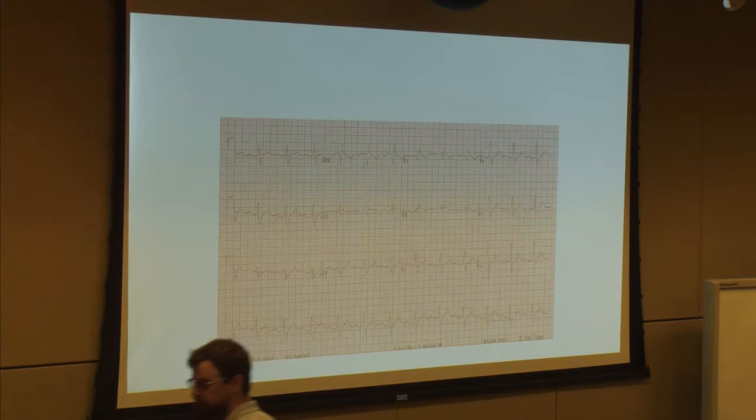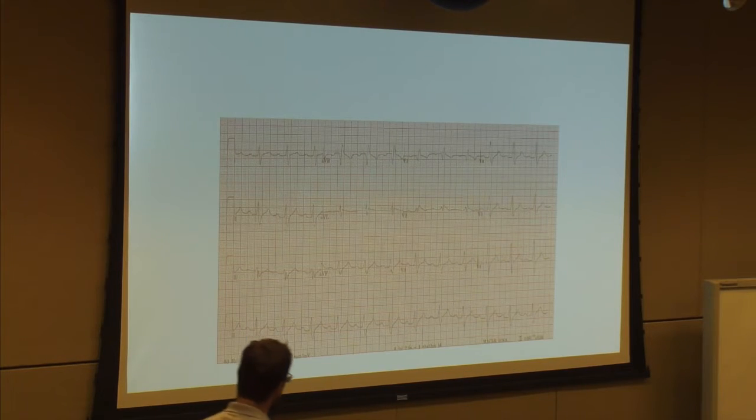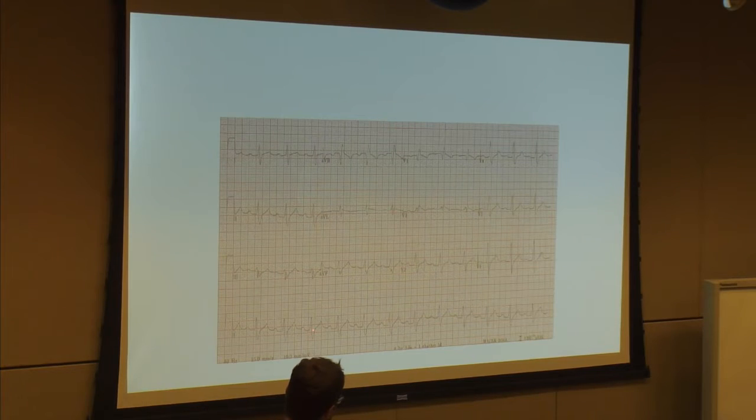What do you see here? When we look at this 12-lead EKG, what do we see? I'm sinus because I got P waves with every QRS, right? I'm a little bit long here, so I'm first degree AV block sinus. I'm a little wide in the QRS, so I'm a wide QRS complex.